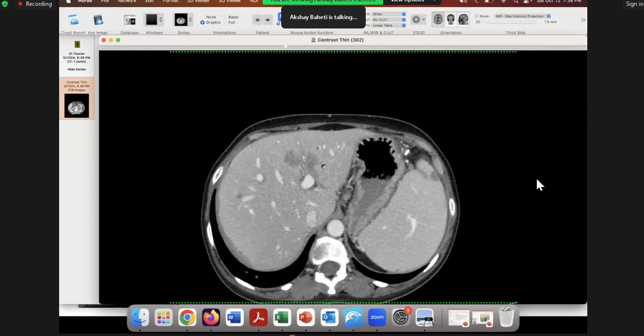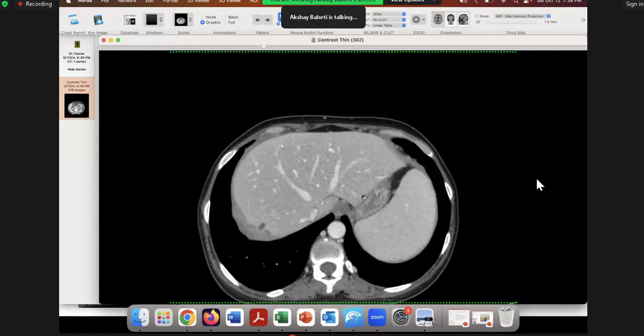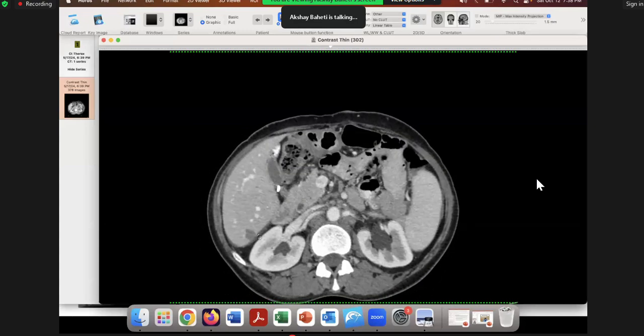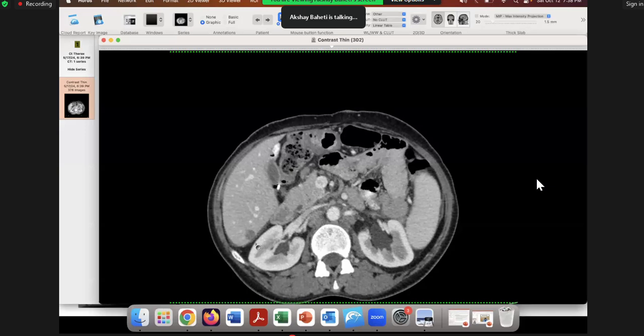My simple rule is anything touching the surface, even if I don't see a lot of deposit, like the splenic one you confidently said is surface, or this one here, which again you said is surface. There's an acute angle here, and someone will say no, this can be intraparenchymal. But my golden rule is that anything touching the hepatic surface, I assume it is a surface deposit.